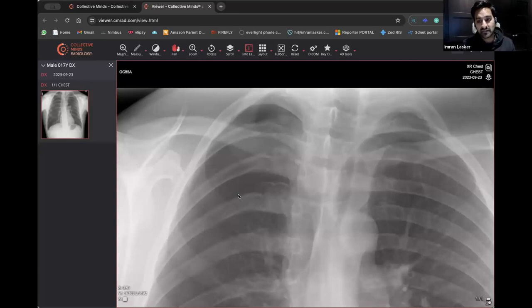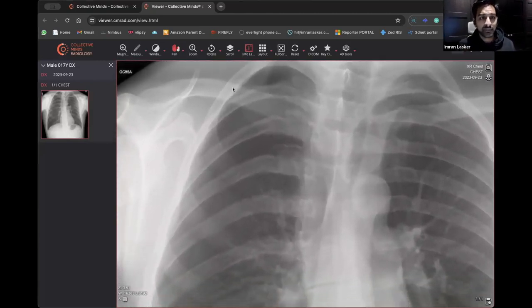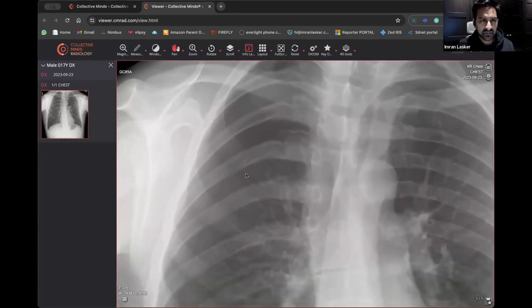Sometimes patients have had, this can be iatrogenic. So they've got a lung nodule or a lung lesion, and they've gone through with a biopsy needle and punctured the lung, essentially, and then you end up having a pneumothorax. Sometimes central lines can do it. There's all sorts of reasons that you can have punctured lungs, right? And sometimes they're just spontaneous. We don't exactly know why it happened, but we can have a good look around the ribs.